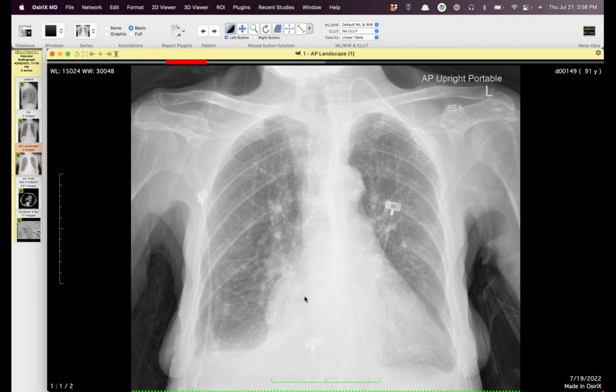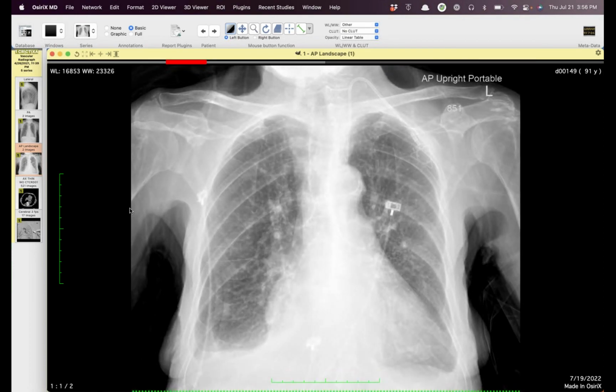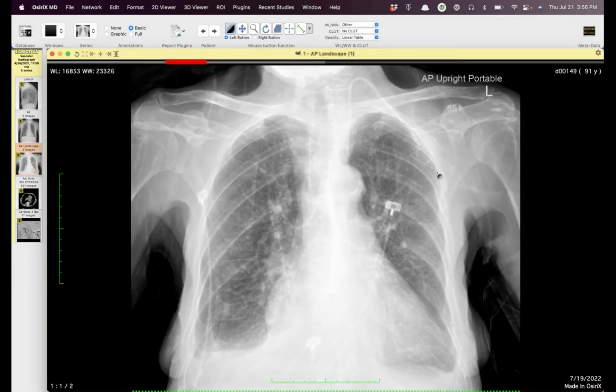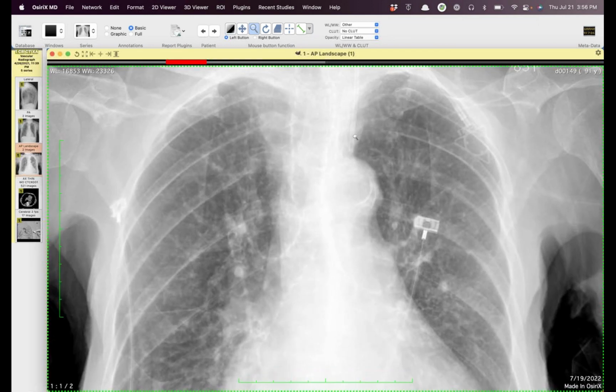All right, this is just a quick one, just an ICU radiograph from the other day. So this patient, you can see they had a right-sided internal jugular port catheter, and that was removed. I don't know why, but a new one was placed, and this was not placed here. But this left internal jugular port catheter doesn't really go down as far as one might hope it would. It goes straight down, and the brachiocephalic vein may be over in here. It may go a little bit lower, but it wasn't working.